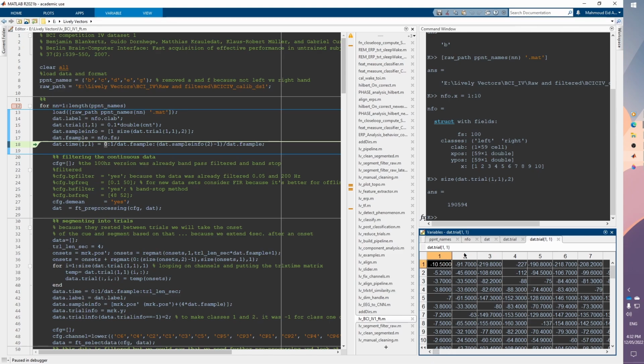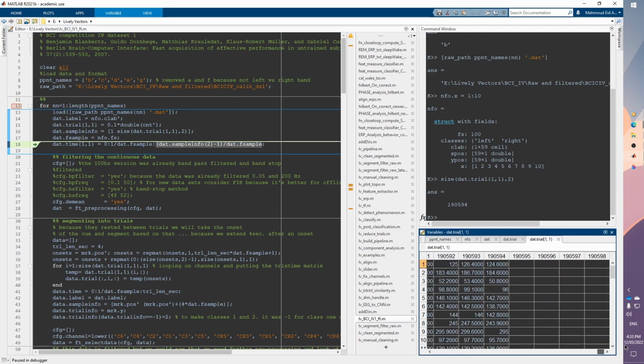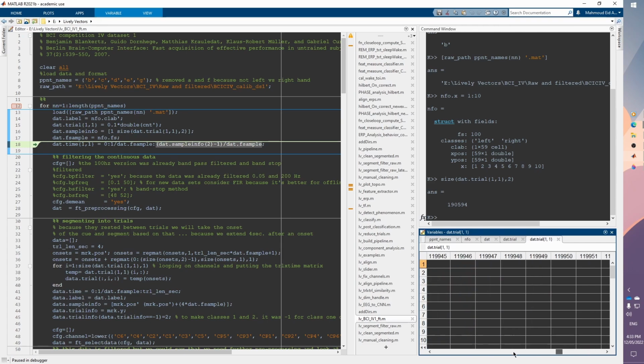With this analysis, or any other analysis, we will see that if we go to the second time point, we are increasing by basically 1 over the sampling rate, so that if we take steps of 1 over the sampling rate up until the point we reach the end sample, the end sample, of course, being divided by the sampling rate again, we will have a vector of time representing the actual time of each sample.